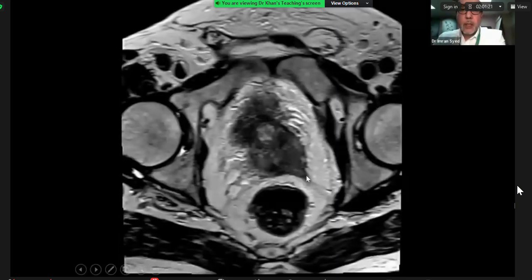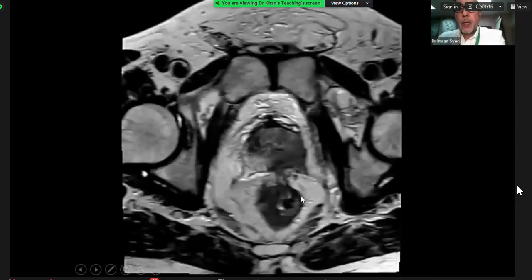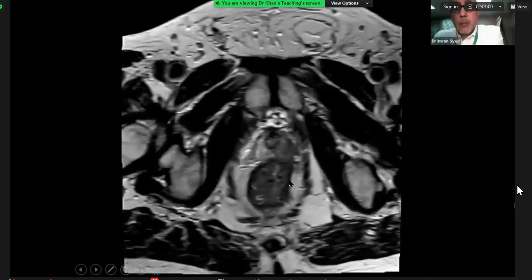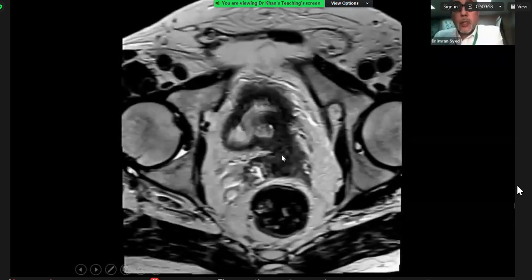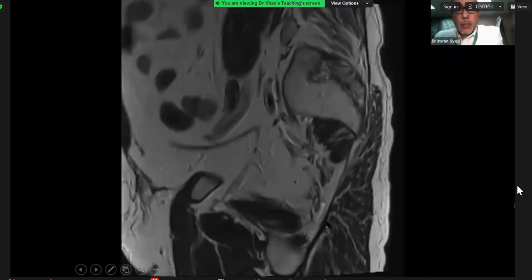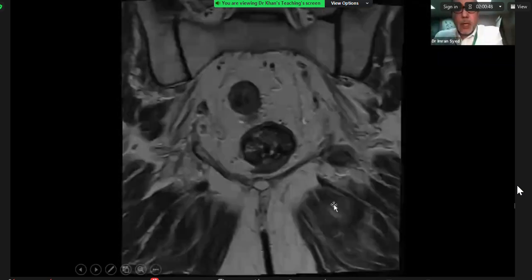So all in all, this is a T4 tumour, and the baseline axial imaging, as shown here, has demonstrated rectal wall and bladder invasion. The rectal involvement is subtle, but you can see this stranding, these areas of change within the anterior rectal wall, and the features are therefore those of T4 involvement of the rectum as well as the bladder, as you can see just here. Right, so that's the prostate sequences done. So we're now going to resume the rest of the viva cases.